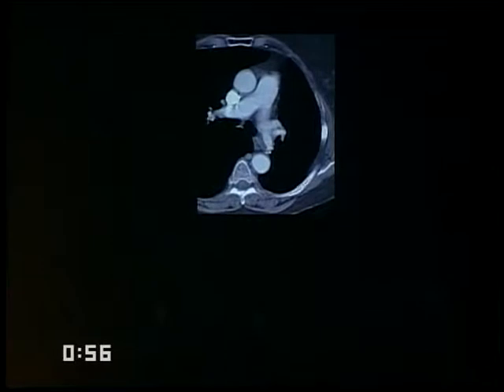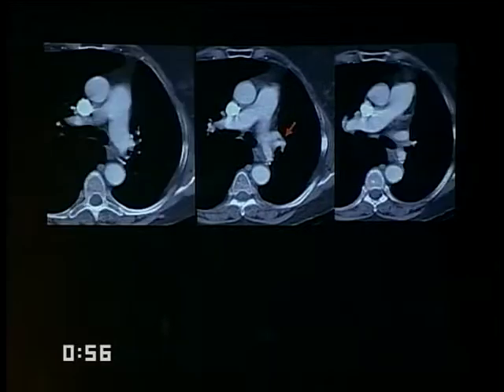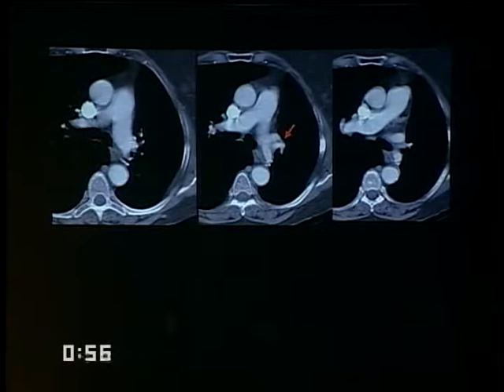We actually had a nice recent example of a potential false positive from this, from our abdominal section using 7 millimeter collimation, perceived a defect in this pulmonary artery. And I'll show you the sections above and below using 7 millimeter collimation. Well, it's clear that there's a certain amount of vascular branching going on, and one would wonder if this might be an averaging artifact.